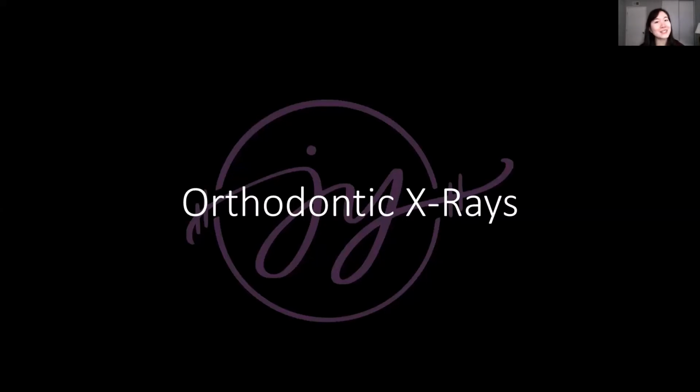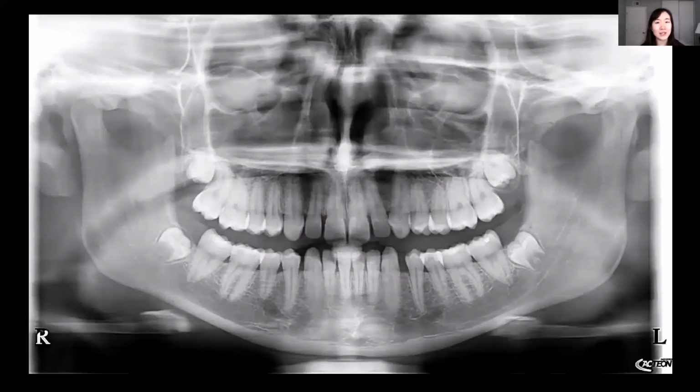Let's start with the panoramic radiograph. Here is an example of a panoramic radiograph. It is literally a panorama of your teeth. I can see your upper jaw, I can see your lower jaw, I can see all the teeth inside. I can even check out the joints, which are where the clicking and popping sometimes happen if you chew gum or you open too wide, as well as the nasal cavity and your sinuses. So I can see pretty much everything here.